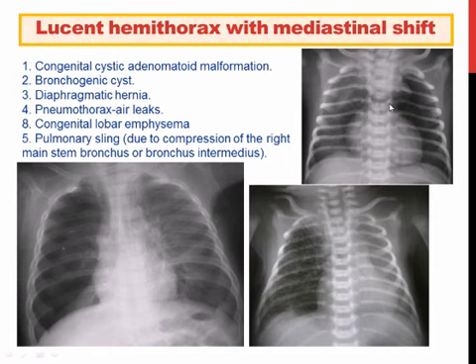Pneumomediastinum in children does not appear as small air collections around the central tracheobronchial tree or esophagus. They are big chunks of lucent air that are situated between the heart and the elevated thymus, causing the inverted V sign or the angel wings sign or the continuous hemidiaphragm sign.